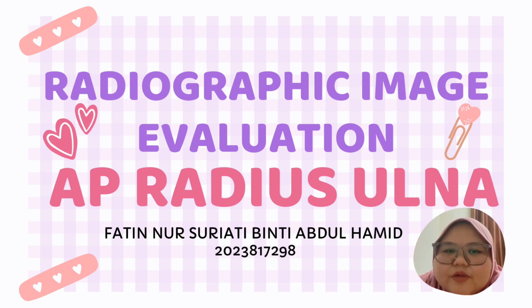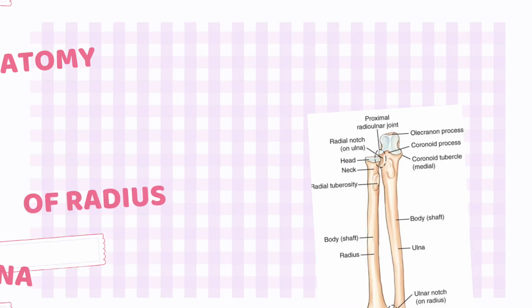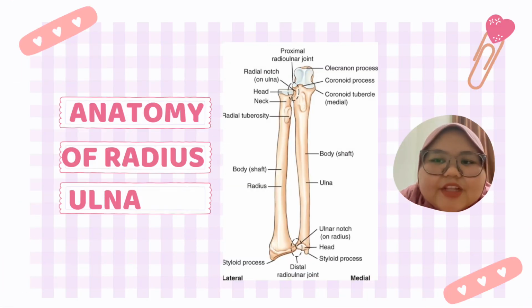2023817298. Today, for subject radiographic image evaluation, I will evaluate AP radius ulna radiograph. First, let's start with the anatomy of radius ulna.